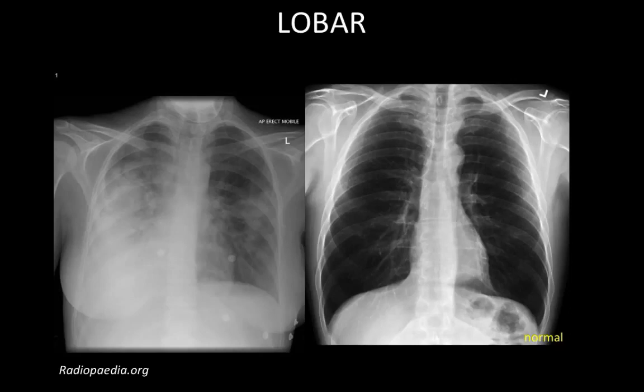pneumonia infiltrates. This is what a normal chest x-ray looks like. You have very clean pleural margins. They're not thickened. You have obvious costophrenic angles that are sharp. You see the whole length of the diaphragm on the left side. It's very clearly visible behind the heart. It's very clearly visible along all of the right side, and you get the heart borders really, really sharp and clear. You don't see any extra shadows within the parenchyma itself.